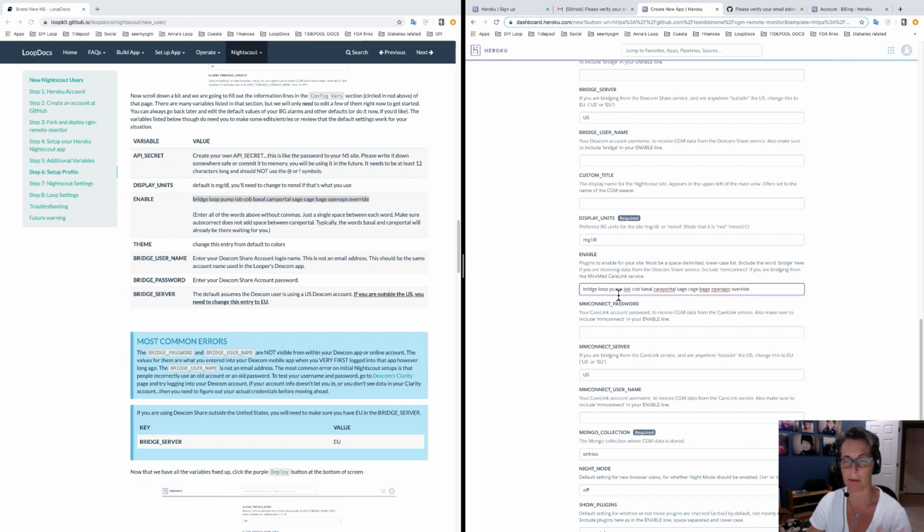We're going to display some pump data, insulin on board, carbs on board, basal rates. Care portal is where you enter treatments, sensor age, cannula age, pump battery age. Open APS, I'm actually having in here because that relates to setting temp targets remotely, which is a possibility in some versions of Loop. And override, because if you're using overrides in Loop, this will turn on the pill there.